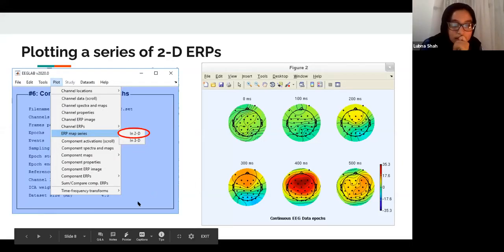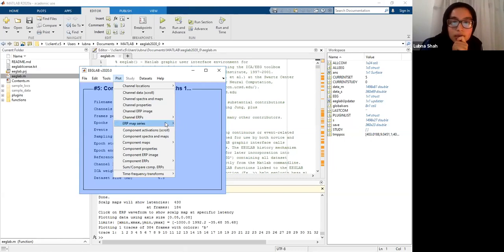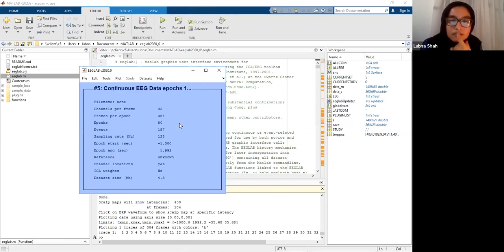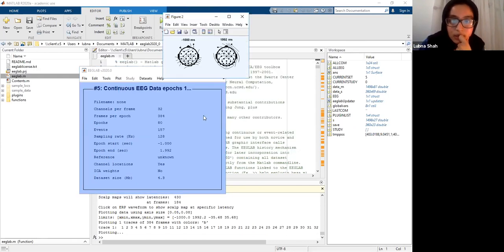All right, so I'm going to keep going, but I'll share my Citrix screen again. We just need to fill in the latencies. It usually fills them in automatically for you. But if we go here in 2D, these need to be filled in, but I might be getting the format wrong here. Okay, that's good.